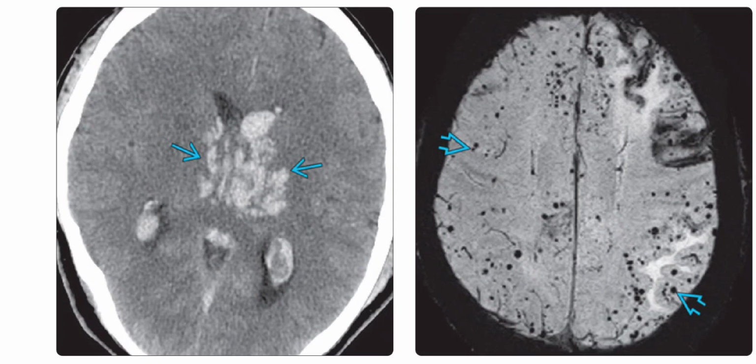Left is the axial CT, and it shows bilateral thalamic hemorrhage related to deep venous thrombosis. Venous thrombosis risk factors include pregnancy, trauma, dehydration, infection, oral contraceptives, coagulopathies, malignancies, collagen vascular diseases, and protein C and S deficiencies.